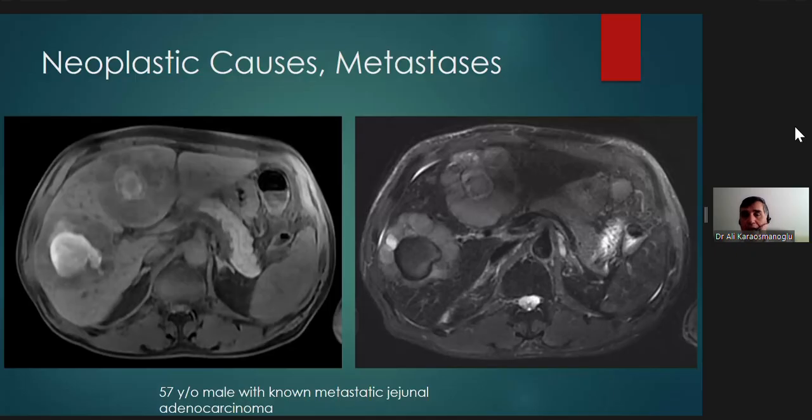There is no intraperitoneal hemorrhage. The hemorrhage is intratumoral. So this patient is more lucky, right, compared to the previous ones, because the hemorrhage is intratumoral. The pain is real and should be treated, but it's unlikely to cause life-threatening hemorrhage because of the confinement of the metastatic disease in the liver parenchyma. So the liver parenchyma basically serves as a tamponade to prevent the extension of the bleeding here.